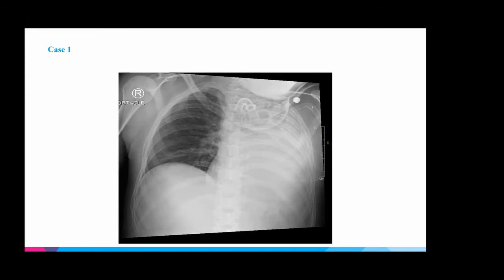Yeah, so it's interesting, right? If you had just done this before you did the POCUS, you have a broader differential where this could just be a complete white out of the lung. It's probably a large pleural effusion, right? Other things I would point to, obviously this isn't a radiology lecture, but the carina is probably over here, so maybe there's a little bit of shifting of mediastinal structures towards the left, so maybe there's some volume loss here.